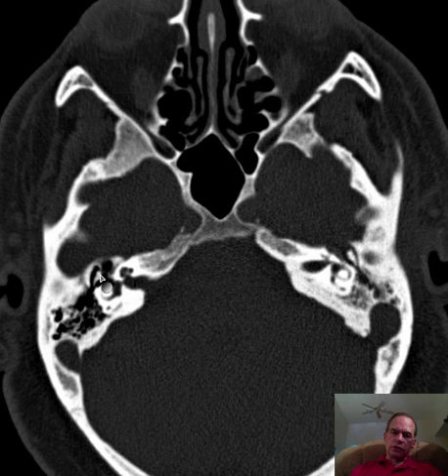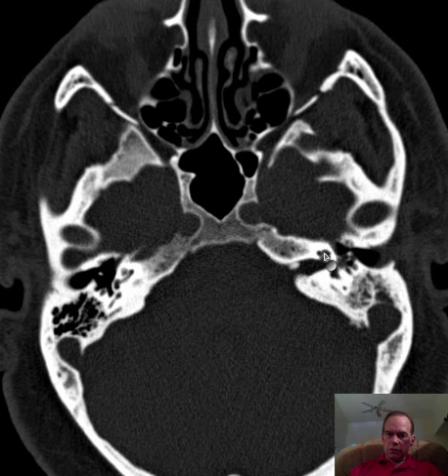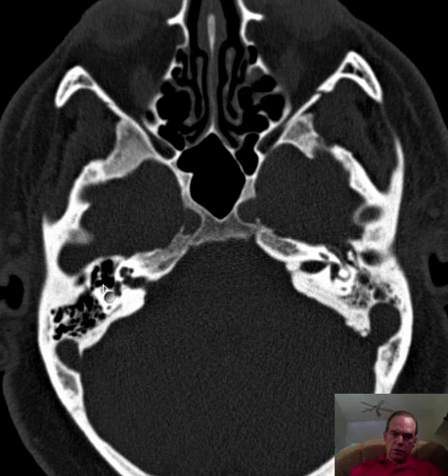The ossicles of the middle ear are activated by vibrations from the tympanic membrane, and these in turn transmit them to the cochlea, and the cochlea in turn transmits them to the eighth nerve, which goes in the internal auditory canal here. And the same thing is going on, of course, on this other side. So here you see the cochlea on the other side, a little difference in the tilt from one side to another. So that's the cochlea, and the vestibular apparatus are right here.